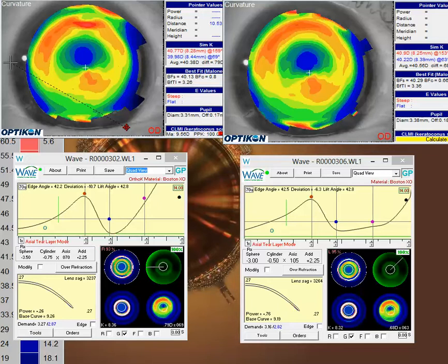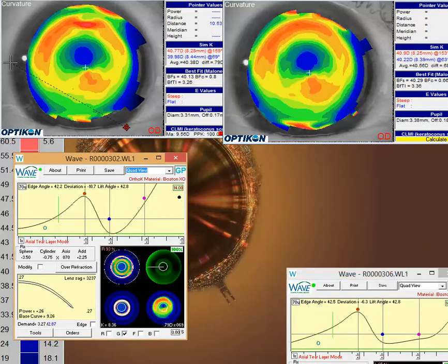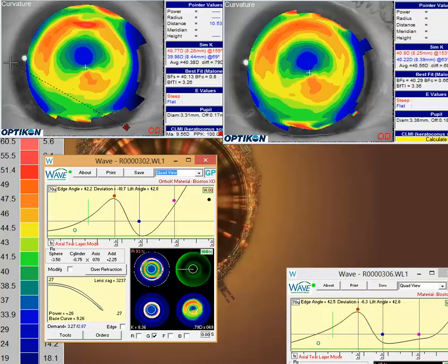I also look at these designs and your refractions that you entered, and they go along with your clinical request of the right eye and the left eye. So if we look first at this right eye for a moment, the designs actually look very nice for a small, mini-scleral design. These actually look really nice.